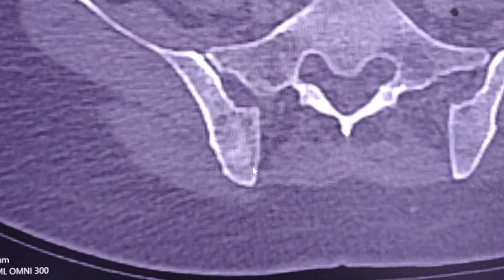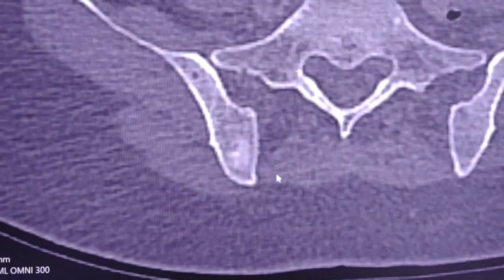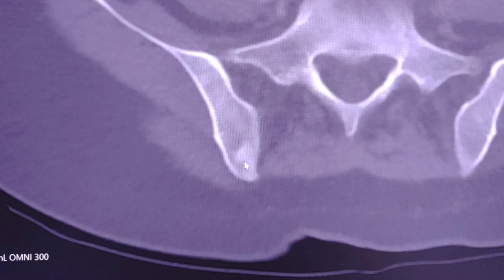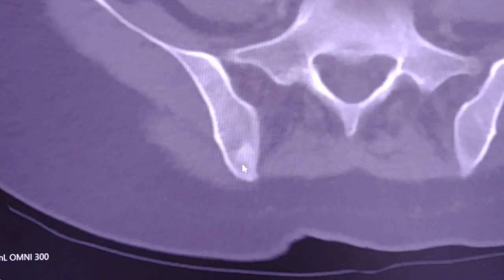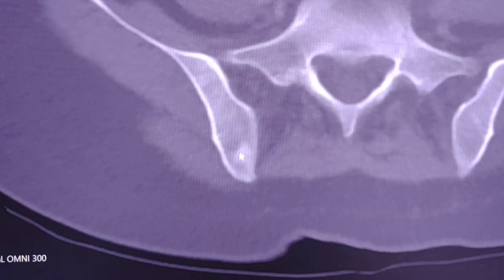Fortunately, I have the previous CT scan, which was performed 7 years ago. This is the previous CT scan. There are some differences. If you can see, the lesion in the previous CT scan has quite smooth contour, and it is smaller with no other changes like the small central calcifications.